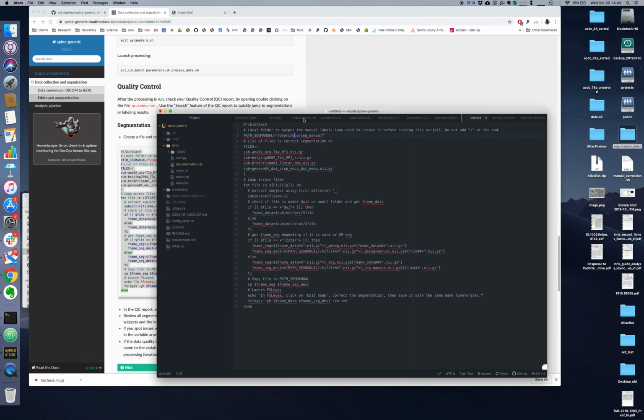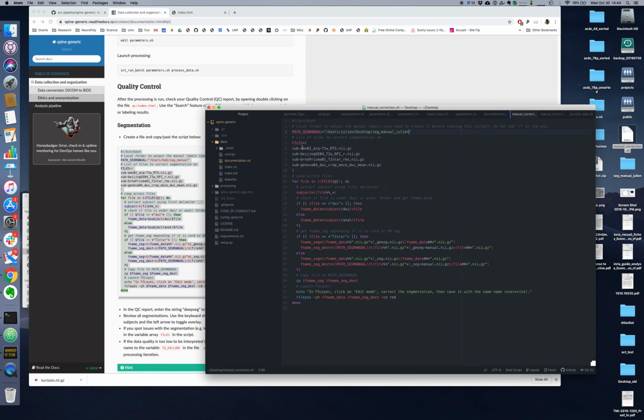So it's going to be users, Desktop, and then I'm calling it seg manual Julien. So the folder needs to be there. If not, you can create it. And so I'm saving it under the file manual correction. Okay. Right. And here is going to be the list of files that you want to correct.